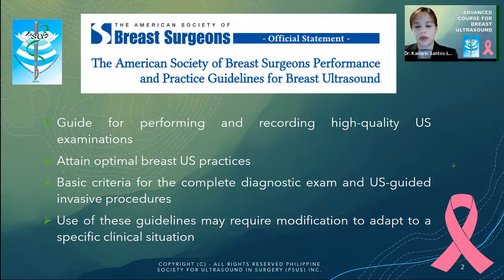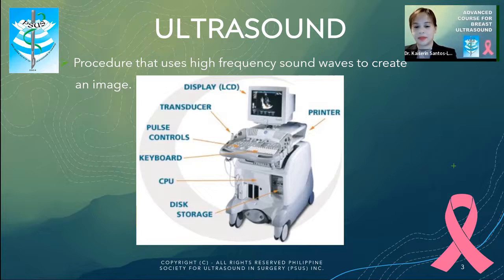how to perform ultrasound, how to acquire and hone our skills, and we will modify these guidelines to adapt to our local practice. Having already attended the basic course, you all have been made familiar with the different parts of the ultrasound machine and the function of each. To review, here is a list of the ultrasound machine parts.